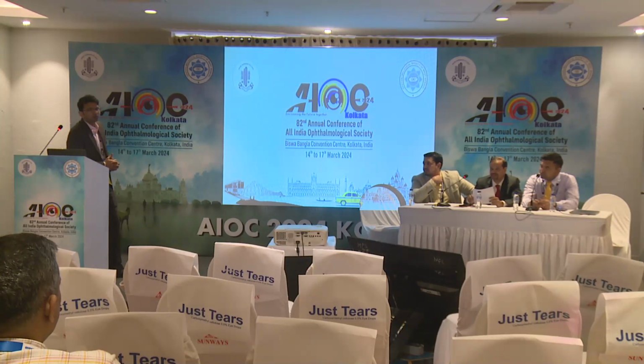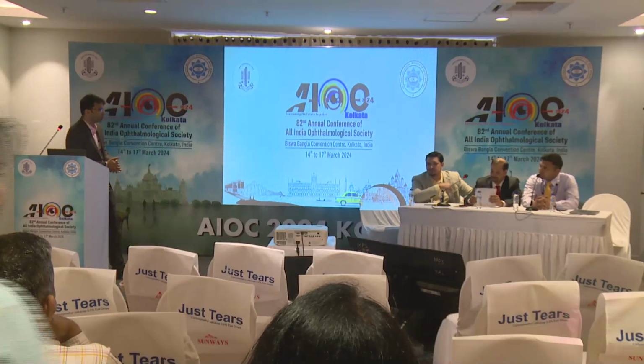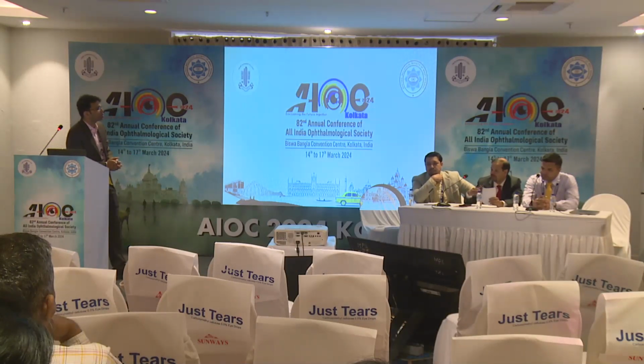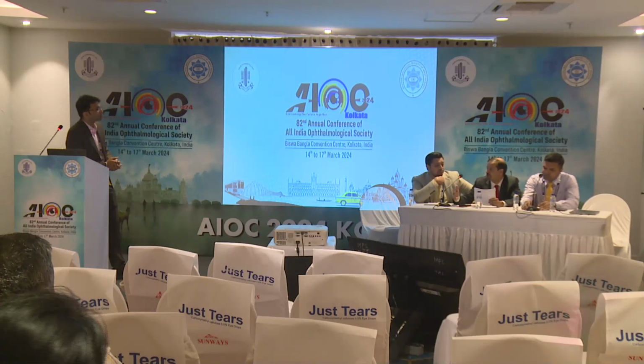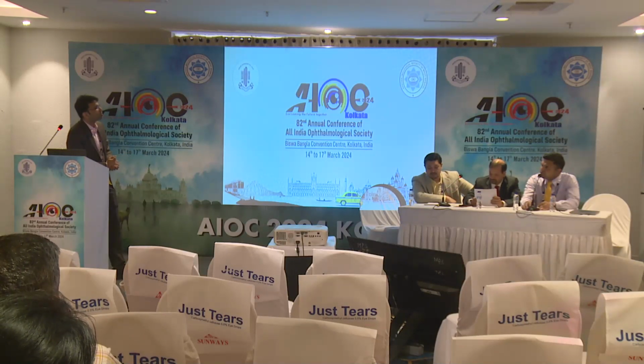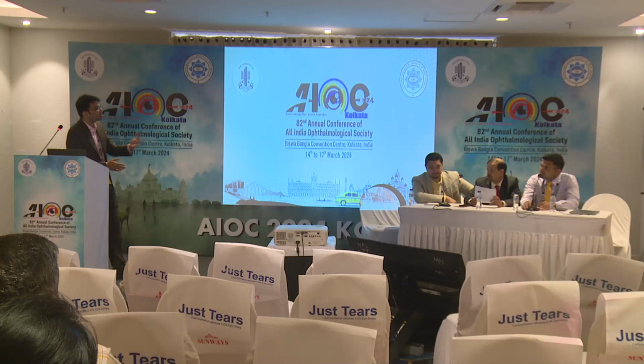So where you don't have a clinical, first is when you want to confirm. When you want to intervene and you want to confirm, you need not go for an FFA. Just document it using an OCT angiography. In which variety of cases? I mean, diabetic retinopathy. Which disease? So CNVM, if clinically you can visualize the CNVM, you need not go ahead with a fluorescein angiography. Just document it with OCT angiography. And sometimes when you have small membranes, they may be picked up on the OCT angiography, and you need not do a fluorescein angiography in those patients. And also on follow-up, when you want to see the change in the network which is there.